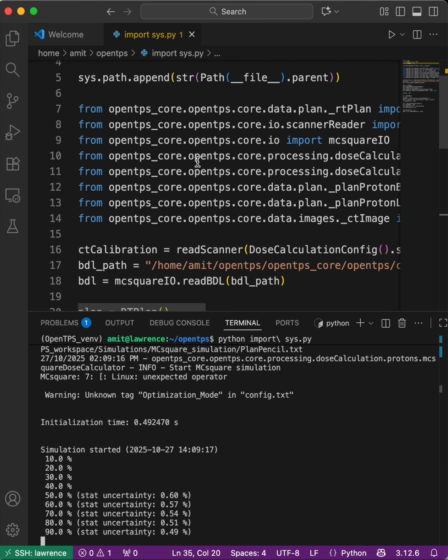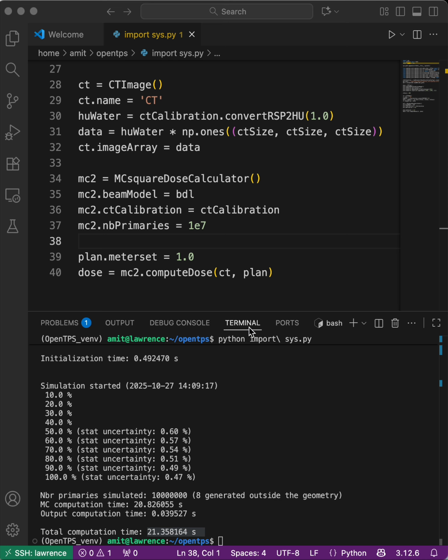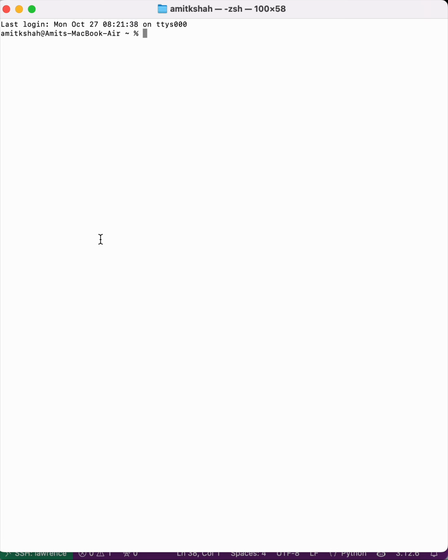So for that I have made a Jupyter file just for plotting, because it's very difficult to plot all the axes through the terminal. Hope it runs. Yeah, perfect. Where is it? Docs.